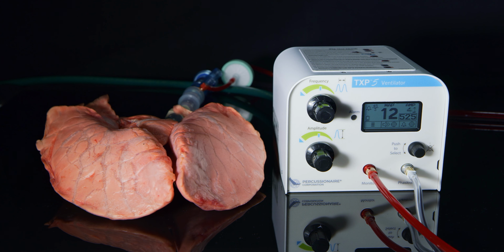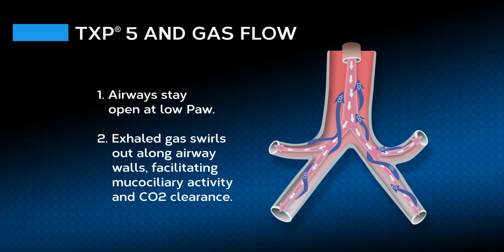As gas reaches the lowest levels of a non-compliant lung, molecules diffuse rapidly, then reverse and swirl up the sidewalls of the lowest airways in a counter-current flow pattern. This effective and highly diffusive action allows for constant and robust gas exchange throughout the entire respiratory cycle without interruption.